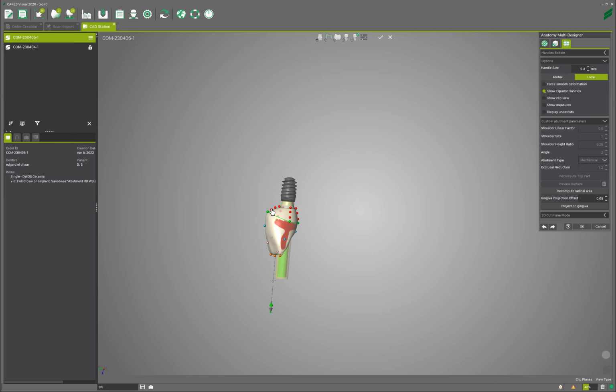And I'm gonna create my subcritical margin. And I'm gonna look here, and I'm gonna reduce this. This looks fine. And I'm just gonna reduce this a bit. Yep. And this here a little bit. There you go. And this is the subcritical that is done nicely. And here I'm not sure. I'm afraid of the socket on the inside, so I'm gonna also reduce it.